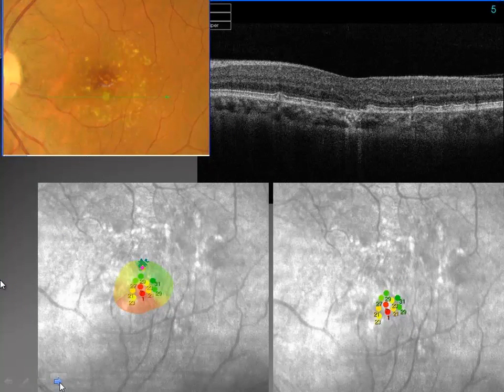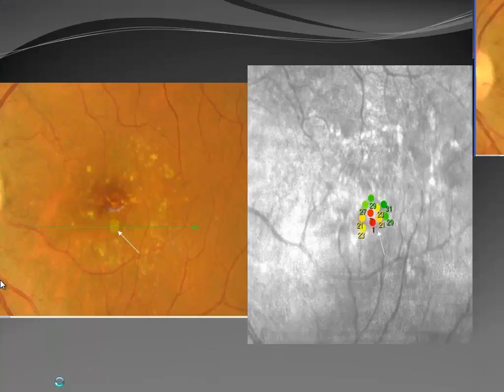We can then put all this together. We can look at the OCT and say, gee, the PIL is missing, the photoreceptor integrity line is missing. That corresponds to this area here. And then we can actually do a specific test. This is a custom test, but what I did is actually I clicked that point twice. I was able to get 2 stimuli right within that point, and then I clicked stimuli around it. I clicked the areas of the retina around it. And you can see what actually happened right over here. I think we have one more slide of that, which puts it together.